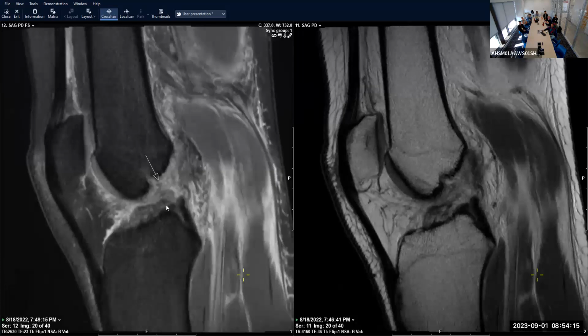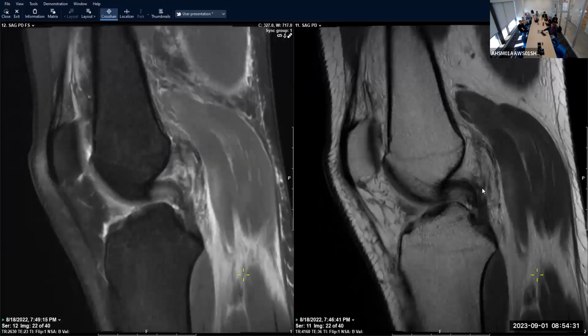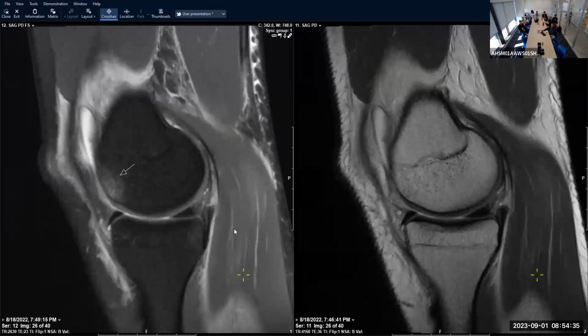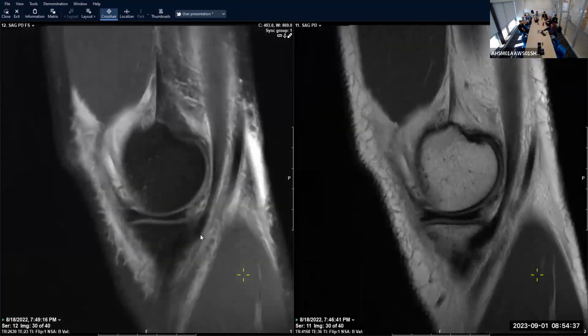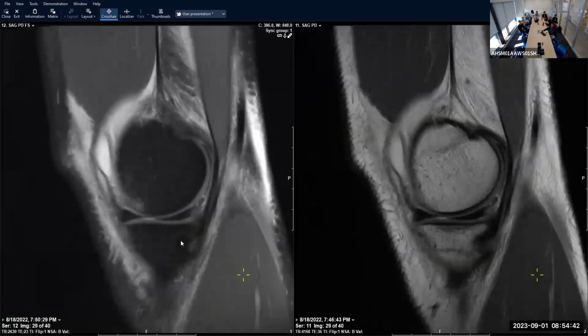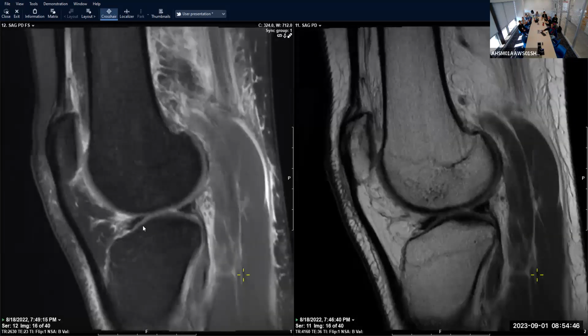See, this is the high-grade posterolateral corner. ACL is blown to smithereens, right? We lose the normal morphology. Yeah, this is markedly abnormal. I don't know what else to say about it, except there are no fibers that I can see going from one place to another. So it's a mid-substance ACL tear. PCL, and then normal-ish posterior, no meniscal tear. So if there's one lucky thing that happened to them, it's that there's no meniscal tear. Quad, patella, but everything else.